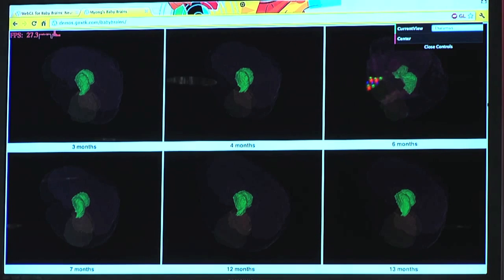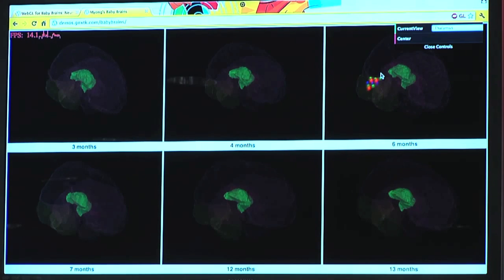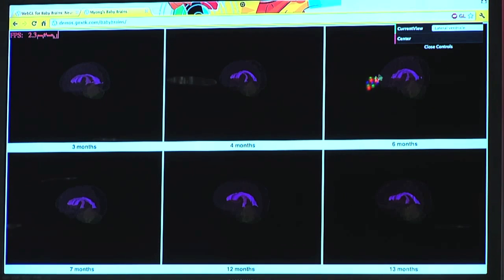And here we have the depth ordering, and I think we'll see some artifacts. Let's see. Yeah, you see this flashing. It's hard to see, but here, see that? In doing the depth ordering, this gets moved back and forth. I'll show another example for that, but that's the problem with the depth ordering. Yeah, there are different structures. You can center the brains again.